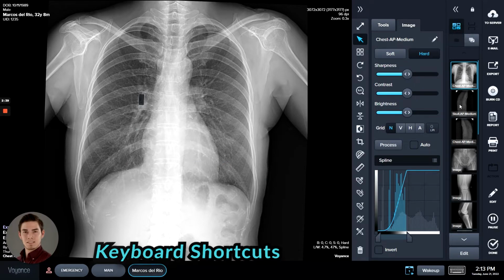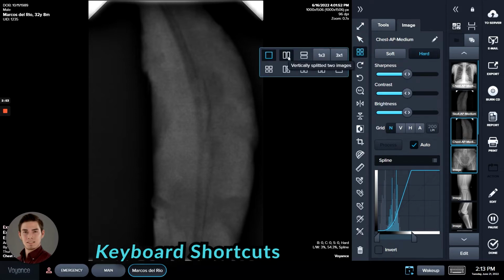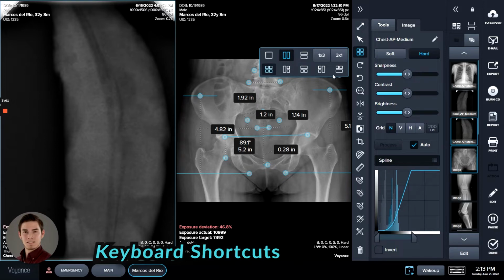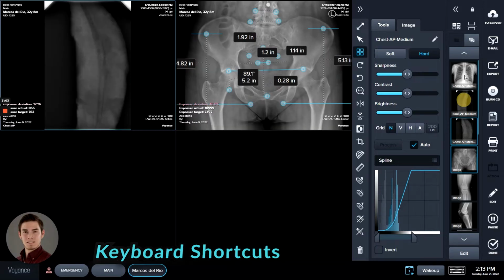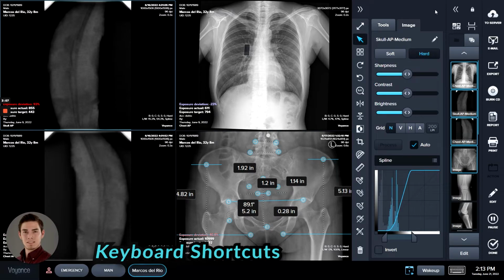In multi-selection mode, you just select anything that you want, highlight it, or unhighlight the things that you do not want, and then get out of the multi-selection mode. This is most useful when working with things that need multiple selections, so things like these multiple image views, and you can select in that way.